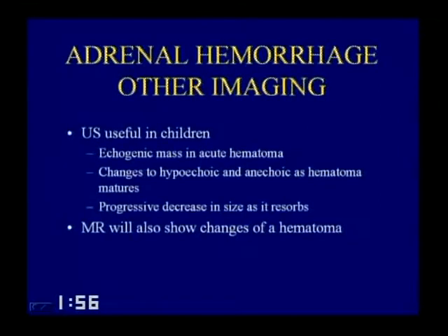Ultrasound can be useful to image these in children, but is not as useful in adults. It'll do just what any other hematoma does, initially echogenic, then it'll get complex, hypoechoic, anechoic as it matures, and eventually, hopefully, resorb. And MR will also show signal characteristics of hematoma.